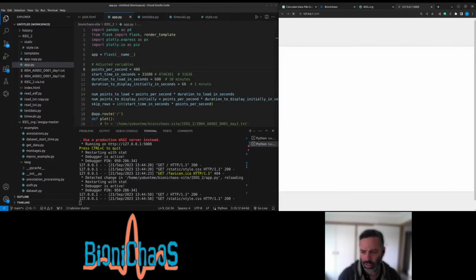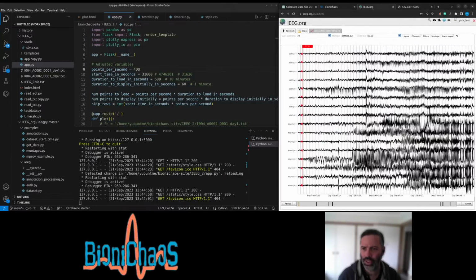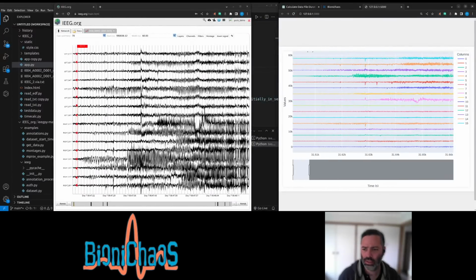This looks like the end of it. I'm displaying 60 seconds. And just check this side by side.